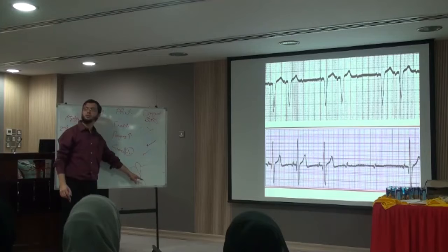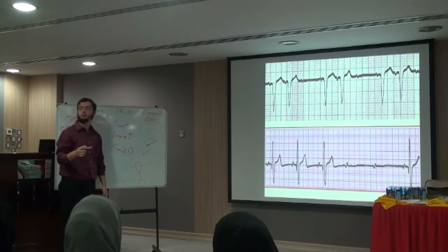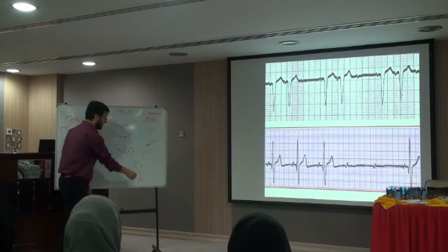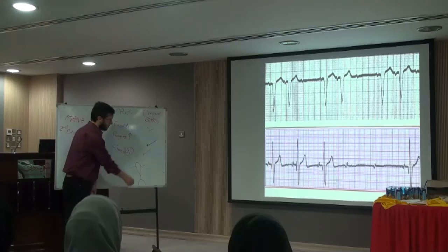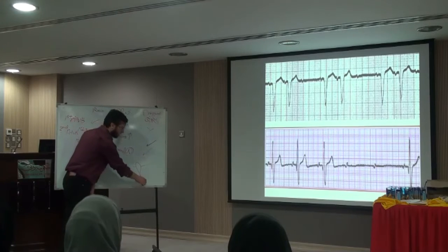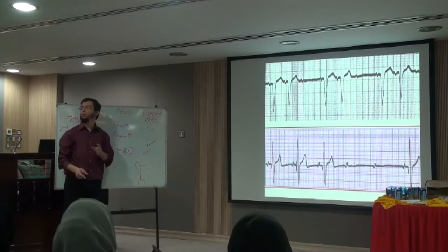We call it suprahisian block. Still, you're going to conduct before the right or left bundle branches. So the complex will be narrow.